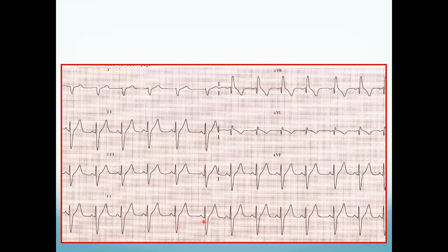Yep. Are they associated? Yeah. Okay, all these PR intervals are fixed. Okay, so we must be dealing with some type of sinus rhythm, right? But we've got these weird looking QRS complexes. So what might we have that's going on?